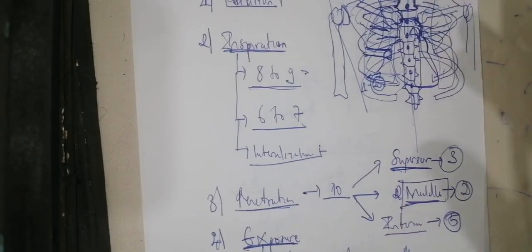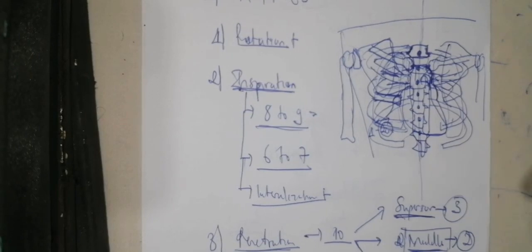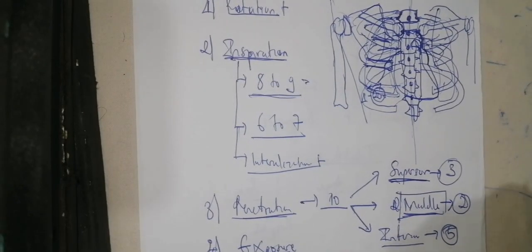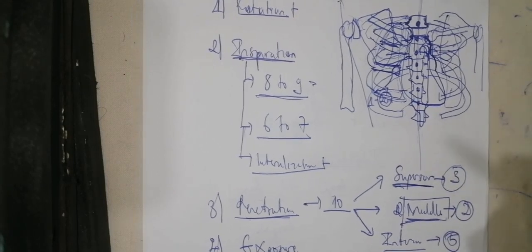So those are the different elements which can tell you that it is a good X-ray, but usually this S, which is for the scapula, is not taken too much into consideration, is it clear? So those are the elements that show you the good quality of an X-ray. After the quality of the X-ray, the next thing you're going to visualize now are the pathologic signs that you can visualize on X-ray.